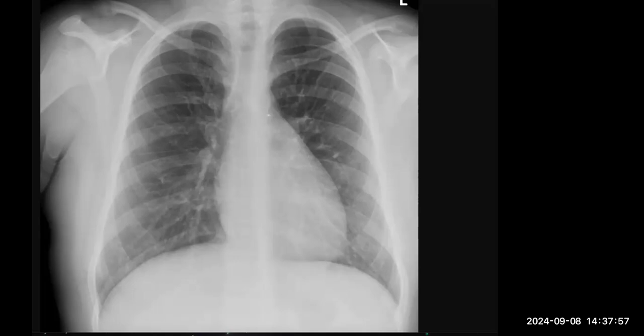You can ignore that. Let me tell you, this patient had a history of cardiac surgery. Okay, cardiac surgery. I'm looking for any features of mediastinitis, any air in the mediastinal space, which I'm not able to appreciate. The patient is asymptomatic. The patient came for a routine screening.